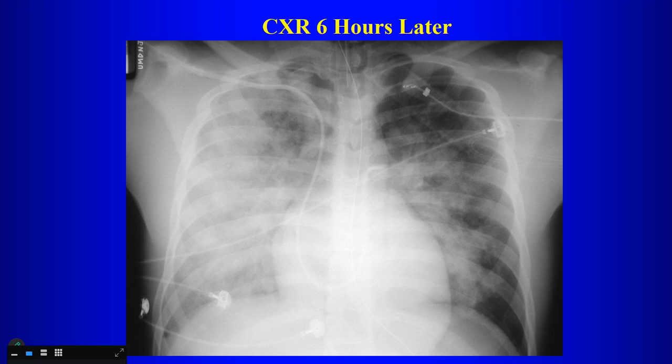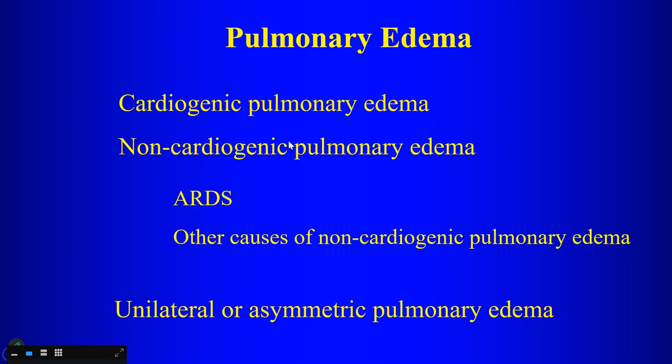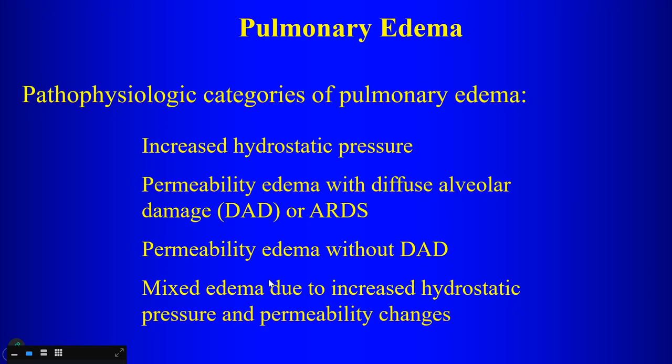Aggressive overhydration with fluid, right? So that might also result in pulmonary edema. This person was actually found in a lake, so this was an example of ARDS from near drowning. Okay. So pulmonary edema, cardiogenic versus non-cardiogenic, and then we'll also talk about asymmetric pulmonary edema.